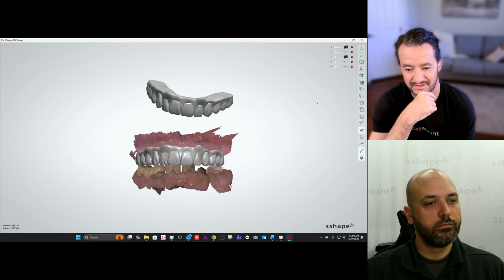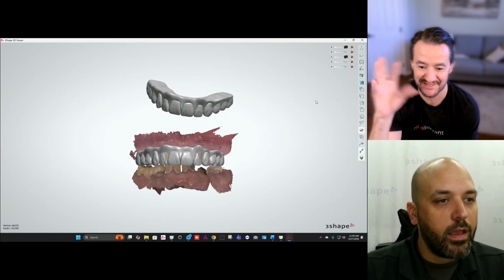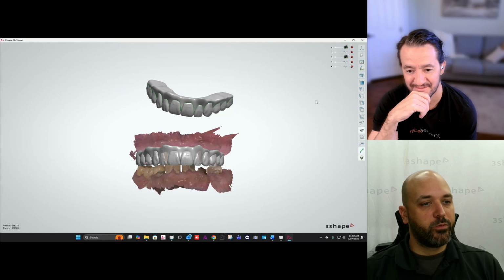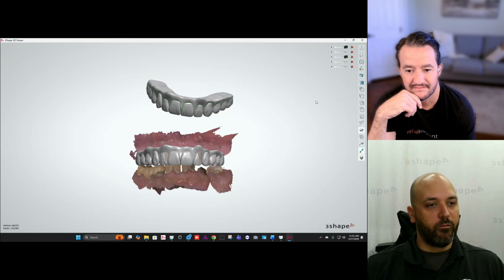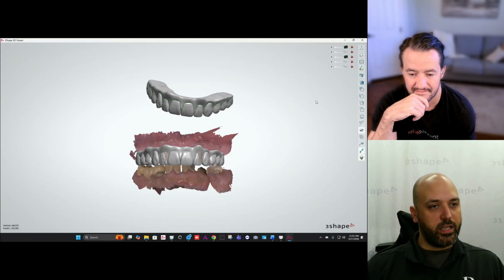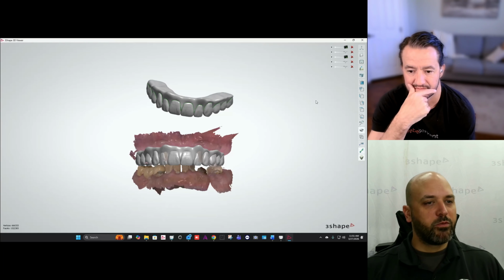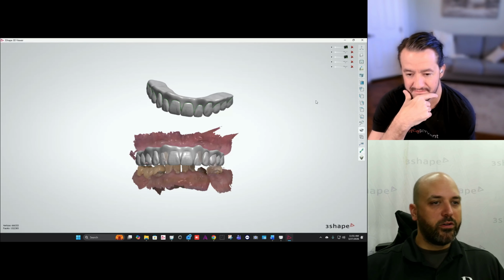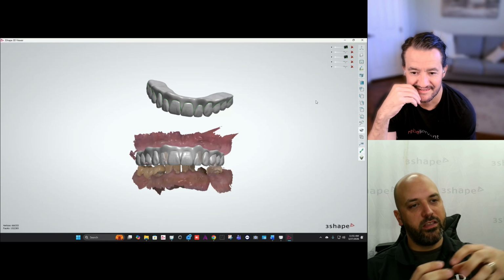How much more accurate is digitally remounting versus physically remounting? It's a lot more accurate, because when I'm doing these alignments it's virtually done. The computer looks for all the similarities in the two scans you're aligning, and it does a much better job. Traditionally we're using putty matrices, which tend to round off as they set up, so things don't fit into them really well.